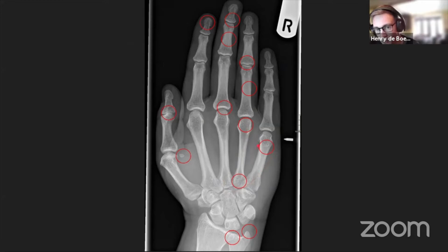This would be the neck of the right little finger metacarpal, and this would be the head of the right ring finger metacarpal. The joint between the metacarpal and the proximal phalanx. So the fingers, there are 3 phalanges, so proximal, middle, and distal phalanx, and this is the metacarpophalangeal joint, or MCP joint.